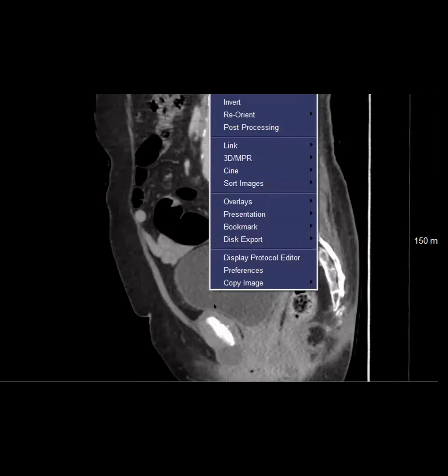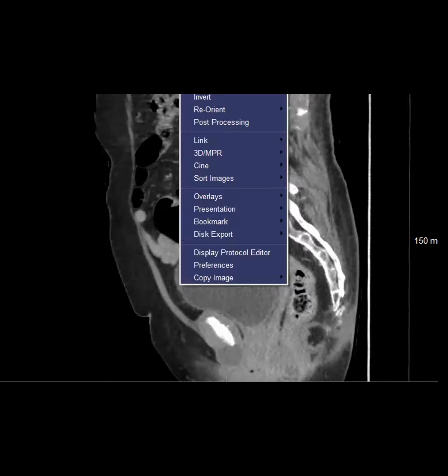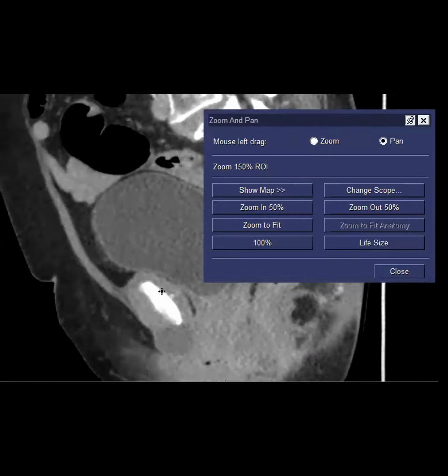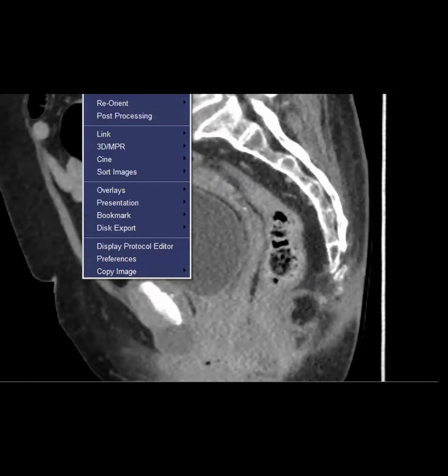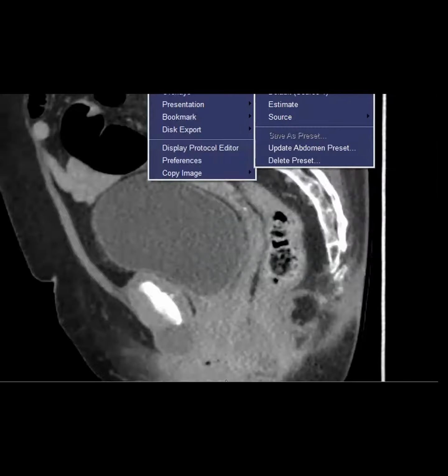Looks extra GYN. I'm sorry? It looks like the epicenter is coming from the pubic symphysis rather than the urethra. Can you show the bone windows initially? Sorry, go ahead. I'm trying, sorry, I'm still learning the specs. Anna, don't laugh at me. Not at all, can I help you change it? Yes, I don't know what I'm doing. The problem also is I'm logging in remotely, so I don't have the funky mouse that we use.